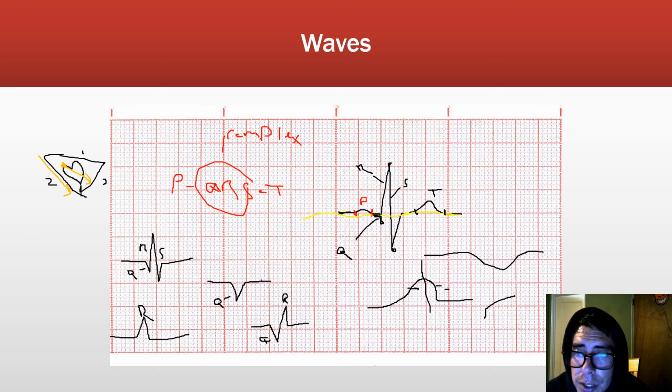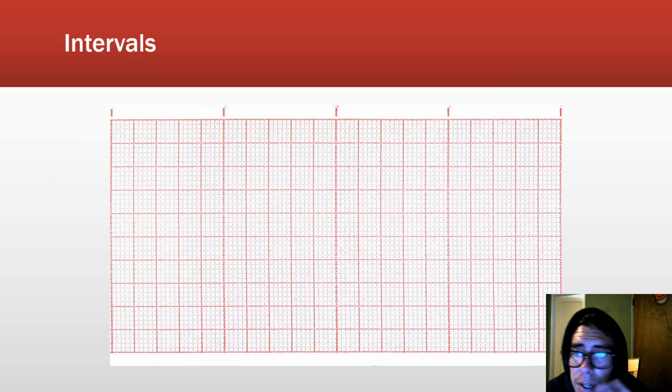So hopefully that makes sense on all the waves. Just watch this part over and over again until you understand, if you didn't understand any of that. Now we're going to talk about intervals. We're almost done. So intervals, I know I'm kind of going through this part fast, but like I said, just rewatch and eventually it'll click, hopefully. So intervals.